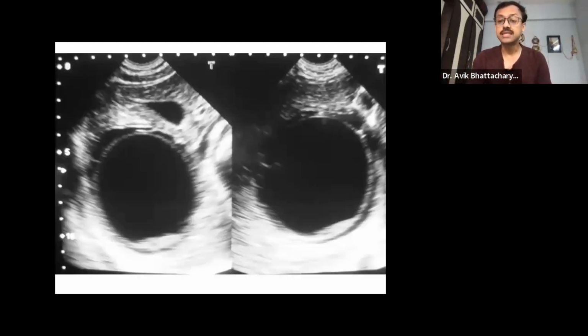Now, not all cysts are simple cysts or the cysts of polycystic liver disease or polycystic kidney disease. Some of the cysts are infected cysts, and the well-known infective cyst in the liver is hydatid cyst. Hydatid cyst has got 5 different WHO categories. How do we classify intrahepatic hydatid cyst?